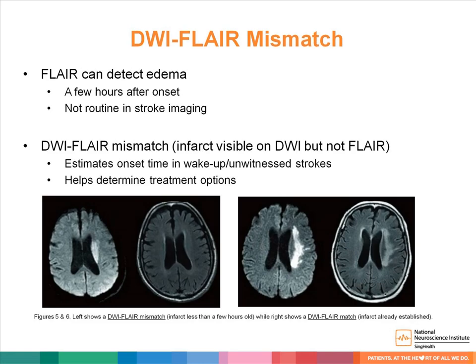FLAIR appears as T2-weighted images, but signal from regions of water is suppressed and appear black. Tissue edema appears hyperintense, but usually only a few hours after onset. FLAIR is less sensitive compared to DWI for detecting infarcts. Thus, it is not routinely done.